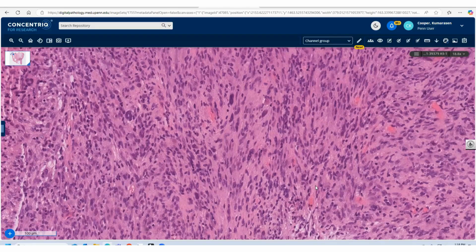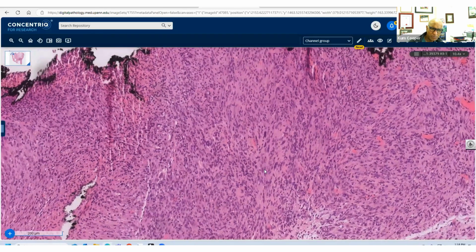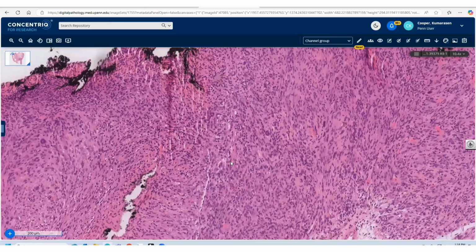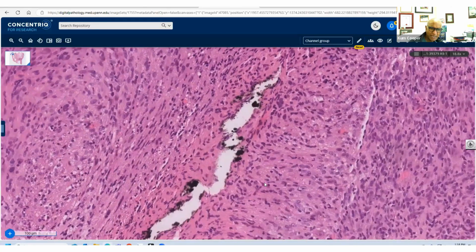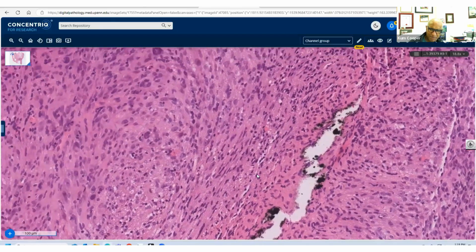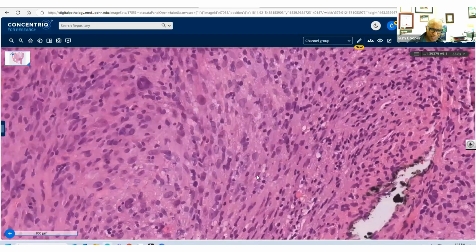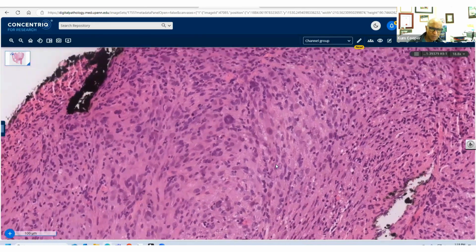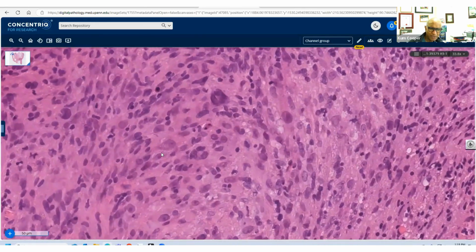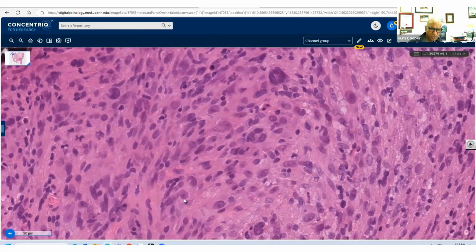Myoepithelial markers? Epithelial, myoepithelial, all negative. That's a good thought, thinking, could this be myoepithelial as well? Can I throw in CD68 and inhibin? Yeah, Maria mentioned that earlier, the histiocytic markers, and I told her the histiocytic markers were negative. Some of them do look granular cell, showing you some of this more pleomorphism and large cells, prominent nucleoli.